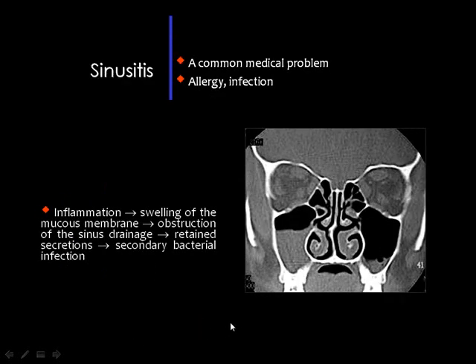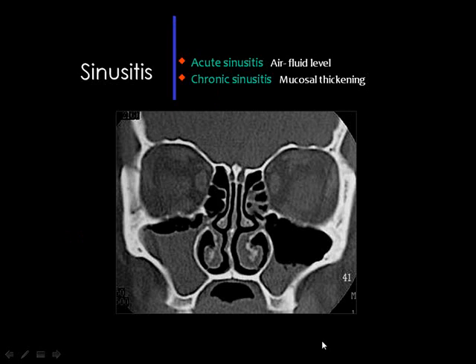Starting with the diseases affecting the paranasal sinuses, the most famous one is sinusitis, and sinusitis is usually diagnosed using this routine study by CT by identifying opacities in the paranasal sinuses. And we can differentiate between acute sinusitis and chronic sinusitis, first by the clinical history, and second by the appearance of the opacities in the sinuses.